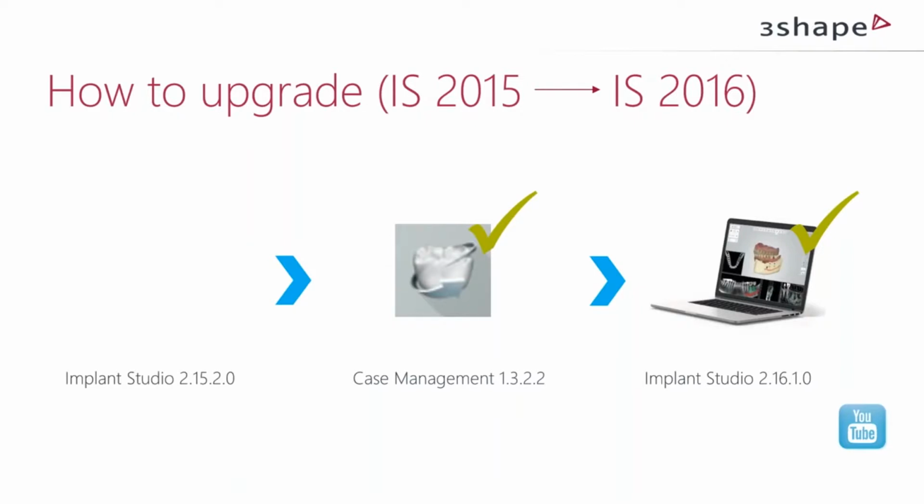We have also created a video so you could see how to upgrade. You will find a link here by pressing this button on our YouTube channel so you could see how to upgrade in a video. But I will also gladly show it to you right now.